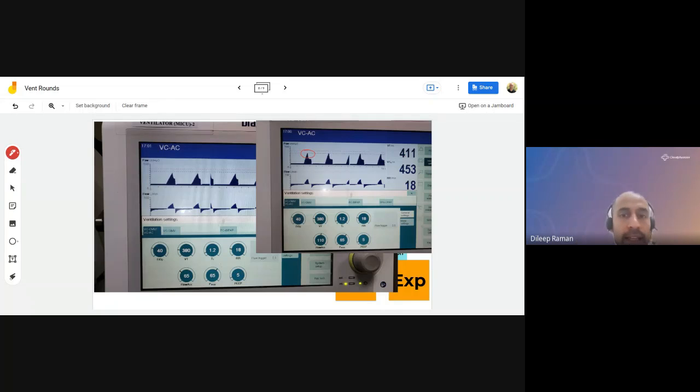It is not opening the exhalation valve because you have a set TI. So what it did was it just stopped the active pressurization. So the ramp, the turbine giving you that 110 millibar per second, that activity has stopped. So now you have a circuit pressure that then just falls down to the plateau. If that dotted line was not there, you would continue to see the pressure rise till the set tidal volume has been delivered. But here the tidal volume set is already delivered. It's above the tidal volume delivered.